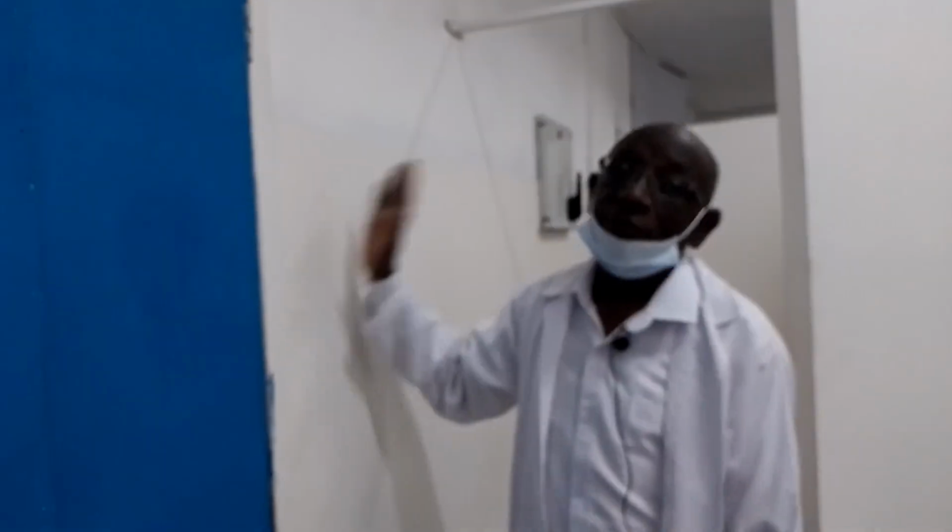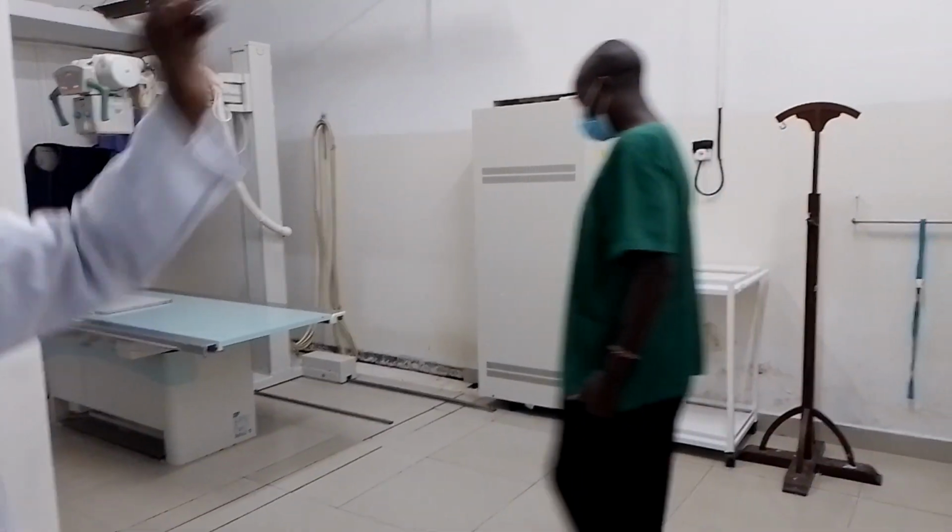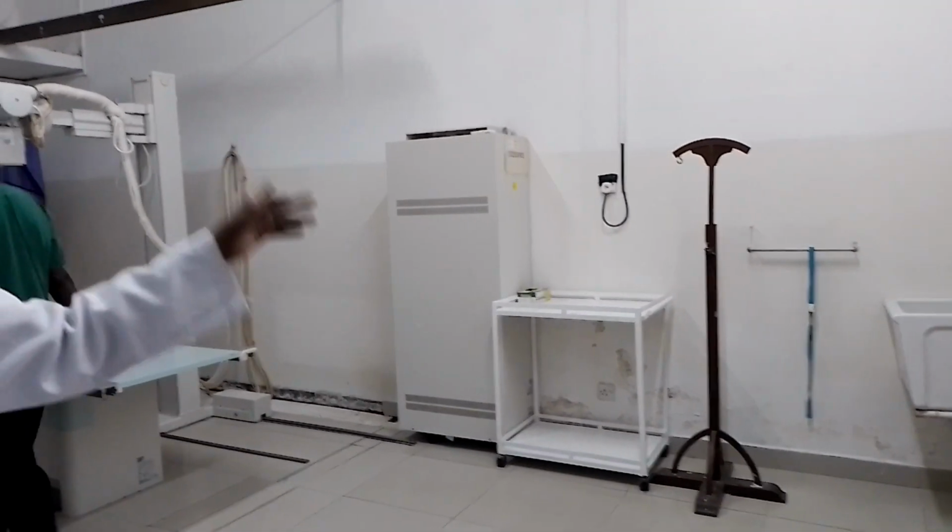The walls themselves are made specifically for the X-ray room, very thick, and the radiation protection board has to come here, check the room, measure, do everything. They check every door, if there is anything leaking out from the wall or any other area, so that you don't affect those people who are outside.